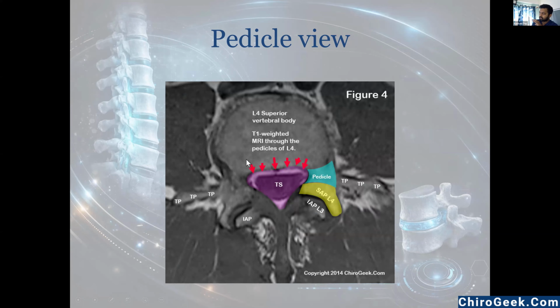Mostly, initially, I also had some difficulty in the MRI. In some cuts, it looks like the disc is coming out. But those cuts are pedicles, and you can see the nice transverse process. So when you see the transverse process here, then that is a pedicle cut. You can anatomically clear this. This is not any disc bulge coming.